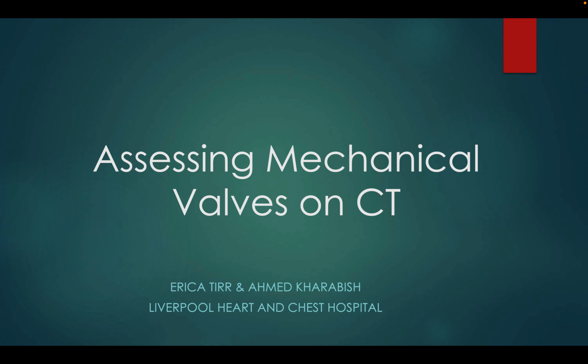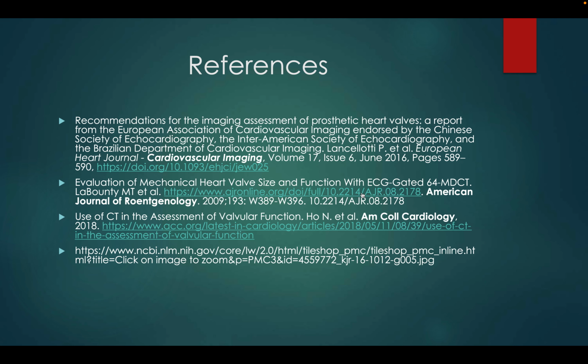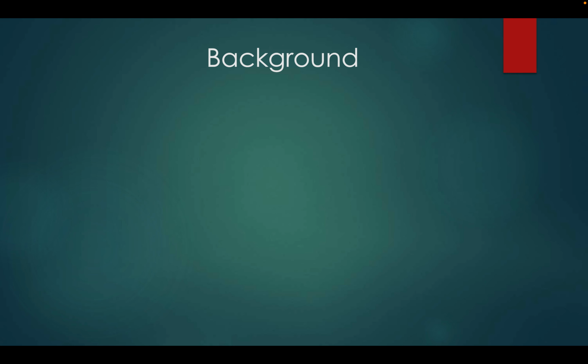In a related video on the channel, we discussed how to differentiate between pannus, clinical and subclinical valve thrombosis using CT. So today is going to be focusing on how to measure the angles and on the leaflet movement.